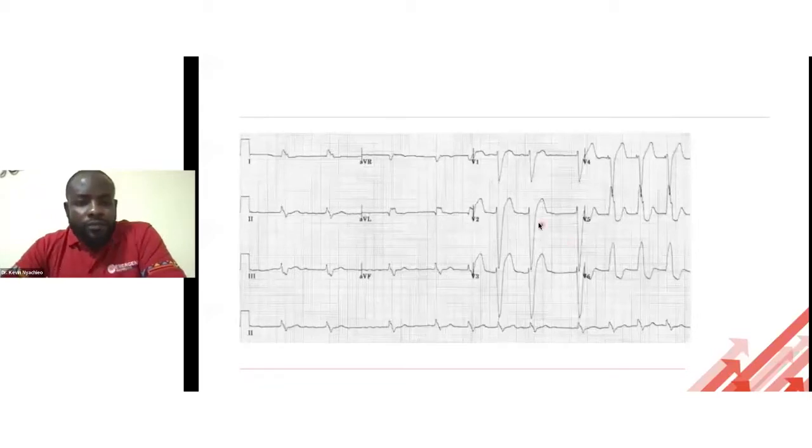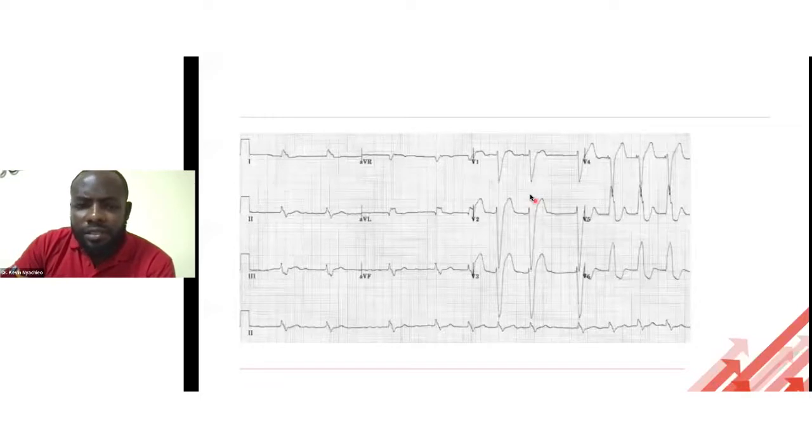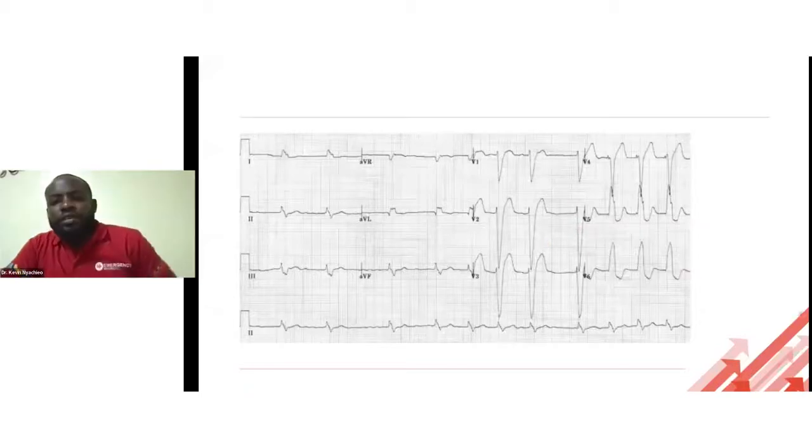Chest pain patient. 60-year-old male comes in complaining of chest pain. It's not so much, but it is still chest pain. It brought him to the hospital at 2 a.m. Okay. He says sometimes he feels like there's a feeling of doom, like he's about to collapse. Vital signs are normal. You do your ECG, then you find this pattern. What do you guys think?